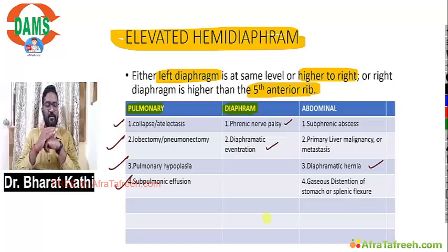Whenever you describe an abnormality, describe it properly. If you are thinking of a pneumothorax: hypertranslucent area without bronchovascular markings with collapsed lung margin. If you are thinking in terms of pleural effusion: homogeneous density with obliteration of the cardiophrenic and costophrenic angles with concavity high up into the axilla. For any standard exam, these x-rays will be sufficient.